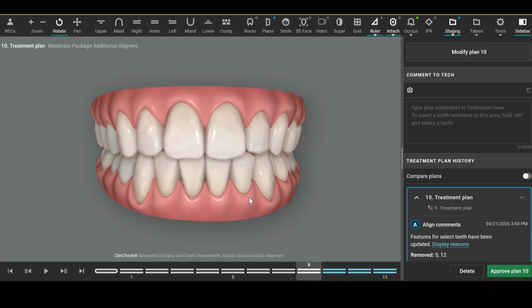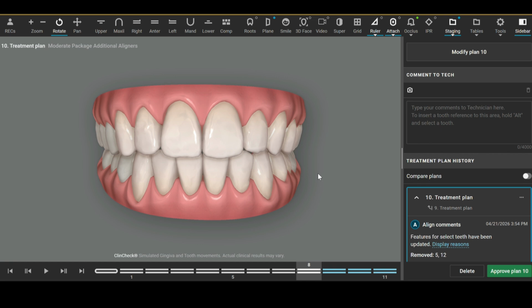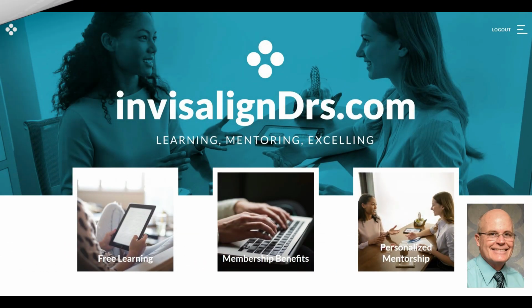So what do you want to get off this video? I think what I would do is just make sure when you get a refinement back that you check those tooth movements. You get everything the way you want it, simplify things as much as possible, run live update, and you're probably going to find that the refinement treatment plan is going to be significantly fewer stages than what they give you. Thanks so much for taking the time to watch this video.